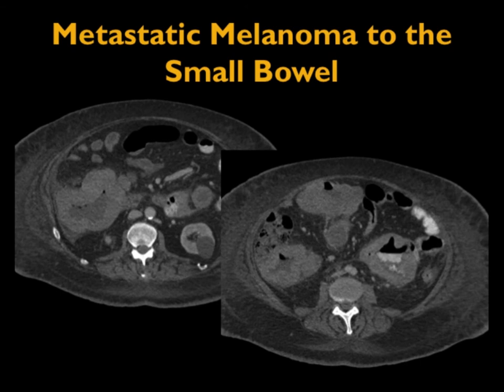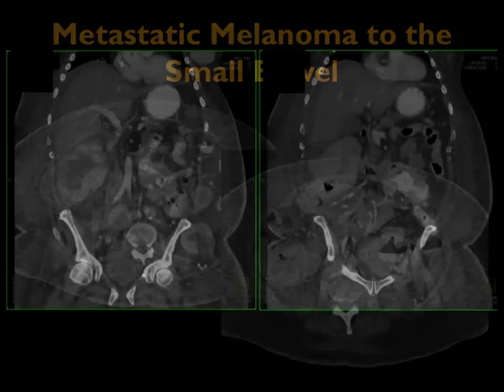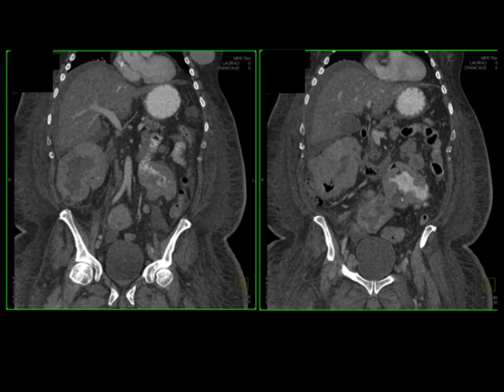Another example, look at this case. Look at the metastases to the patient's small bowel. Solid masses that are enhancing, and we've seen this in a number of cases, sarcomas as well as metastatic renal cell carcinomas. Tumors to small bowel that are metastatic can look like primary tumors.